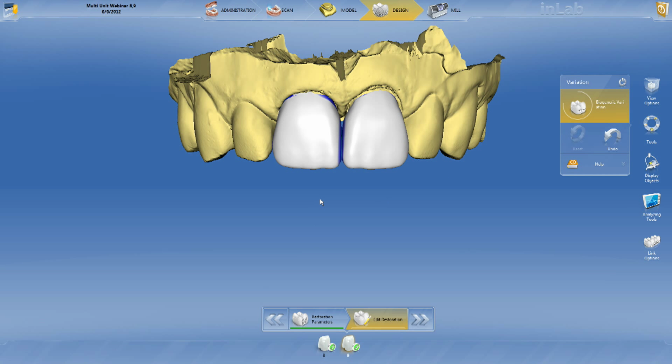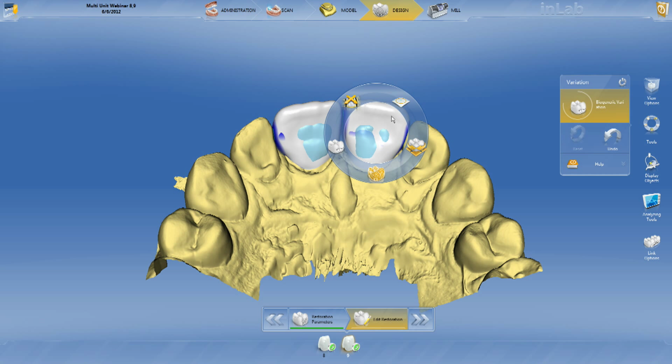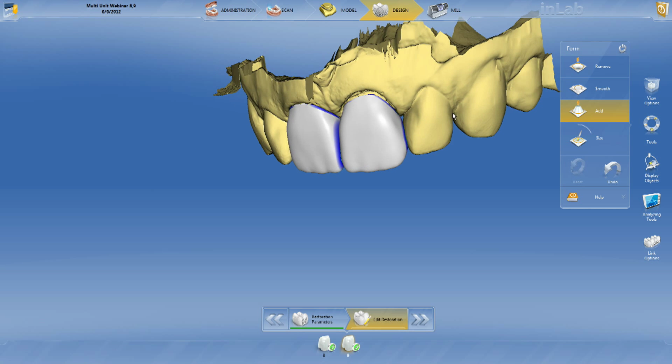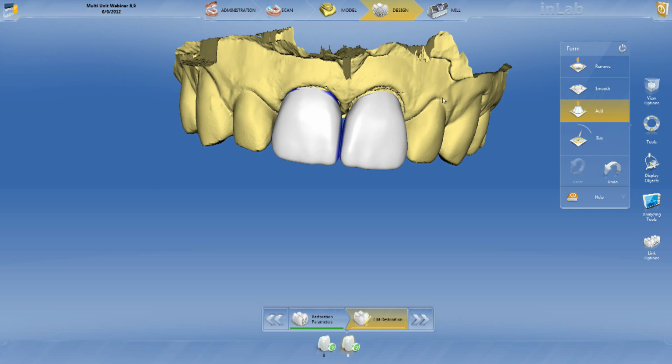So I'm not really sure what time we're at right now, because of course this room does not have a clock. So let me just zip through this really quick, because we definitely want to get to the big case. So like I said, as you can see, whatever I'm doing on one side, it actually does the same thing on the other side. Yeah. And like I said, you can close your erasures there. You can do whatever it is that you want to do.